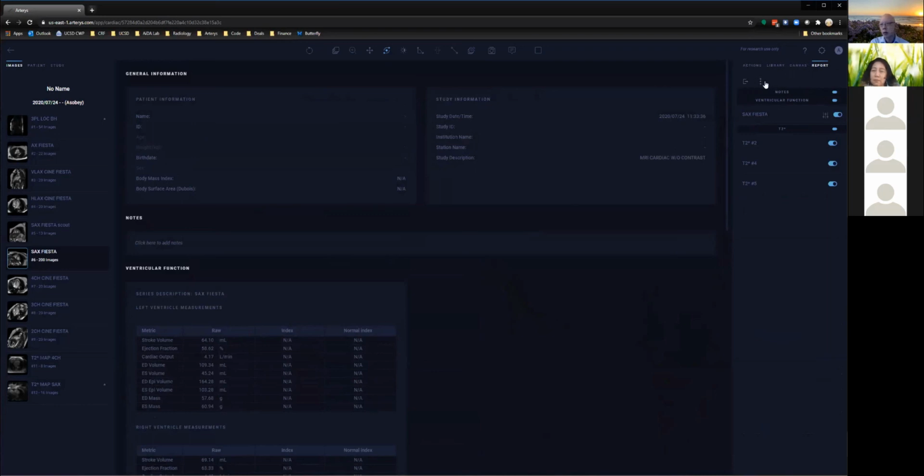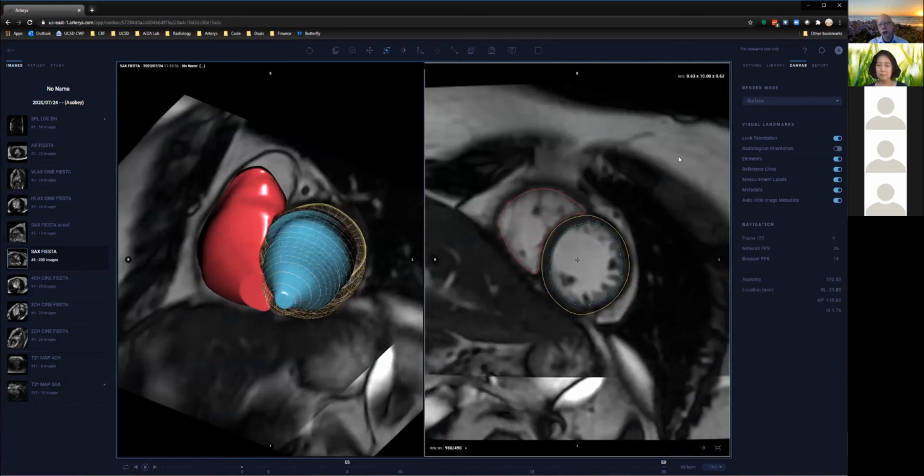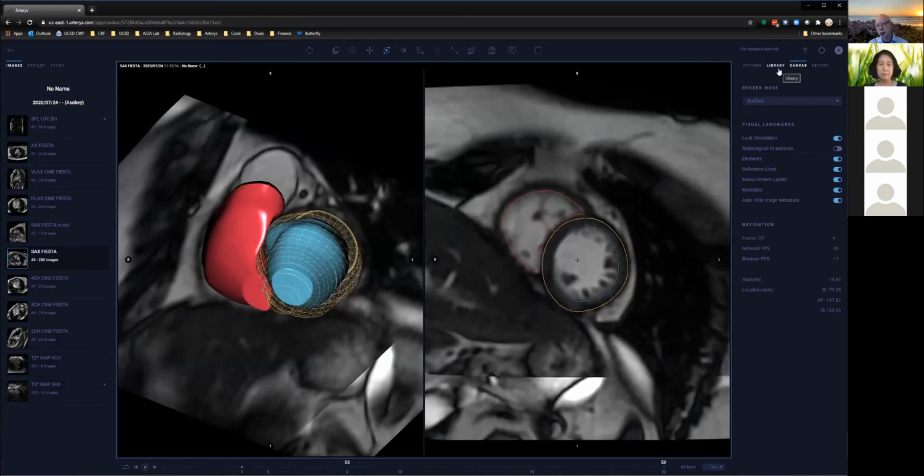Are you logged in through your network, like through your hospital network? Oh, that might be why. Yeah, it won't let you download if you're not logged into your network. You'll notice that all the exams are de-identified. So these are clinical exams, but they're de-identified even if you have access to the software, unless you're connected to the VPN to access the PHI, because the PHI is stored on premises, at least at our institution. So I guess there's some functionality that's disabled when I'm not connected to that VPN.